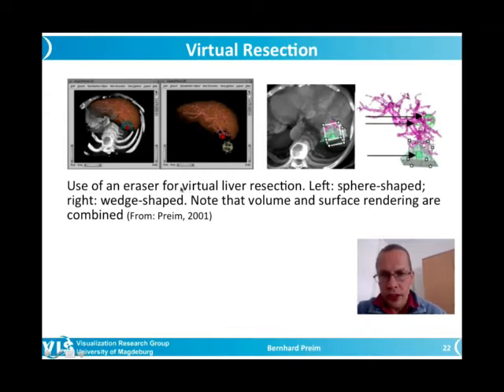So here you see this tool in action. This was a tumor, some vascular structures in the surrounding, and this was removed. Basically, I asked the surgeon here to simulate a real resection of this tumor in the periphery of the organ. So he defined here a resection volume that covers the tumor with a 1 centimeter security margin in all directions. Here you see this tool enabled.